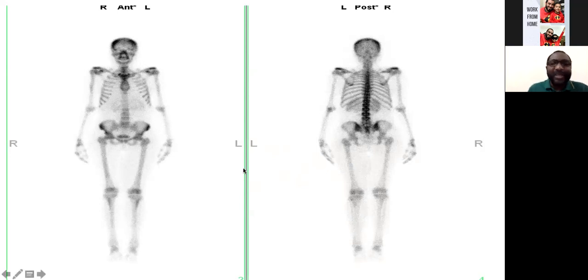But the important thing is, first of all, identifying. How do you identify that this is a bone scan? Because preferentially what you are seeing is the skeleton. You can absolutely say that this is the skull. You can see the skull orbit. You can see the nasal area. The nasal area has a lot of structures within it, smaller bones. That's why it is more intense. You can see the mouth. The mouth does not have a bone. That's why it looks whitish. You can see the mandible.